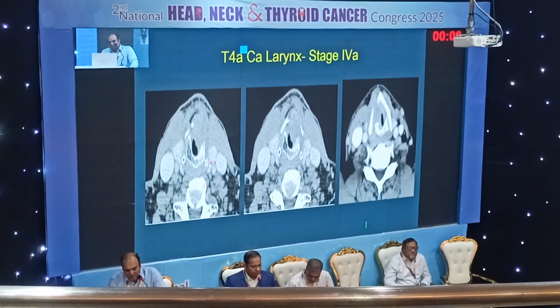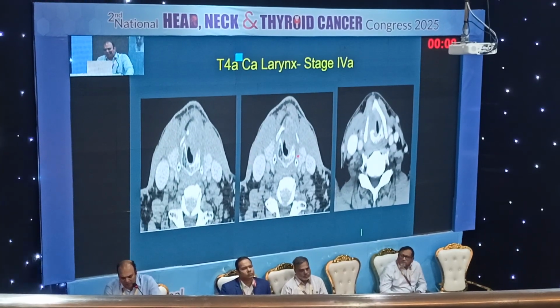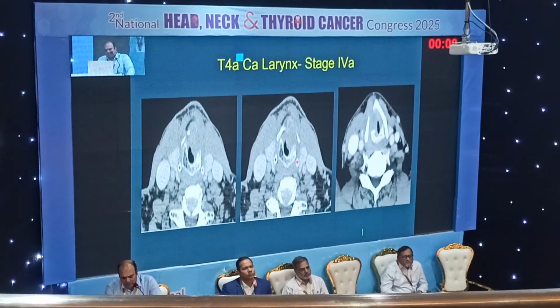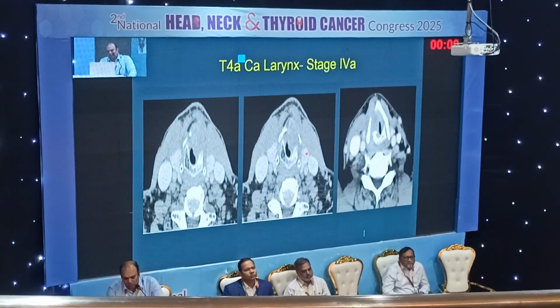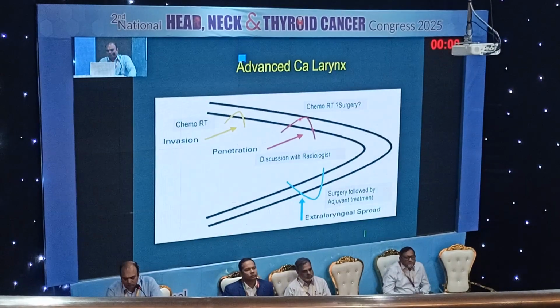Posteriorly, sometimes the lesion is growing posteriorly. What about the prevertebral muscle? What about the prevertebral fascia? What about the carotid artery? What about the thyroid gland? And also the extent of soft tissue involvement anteriorly.